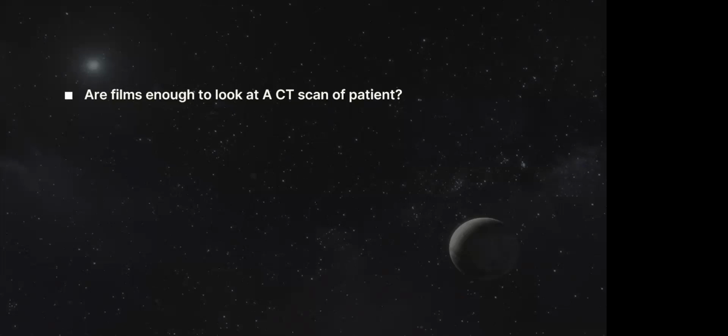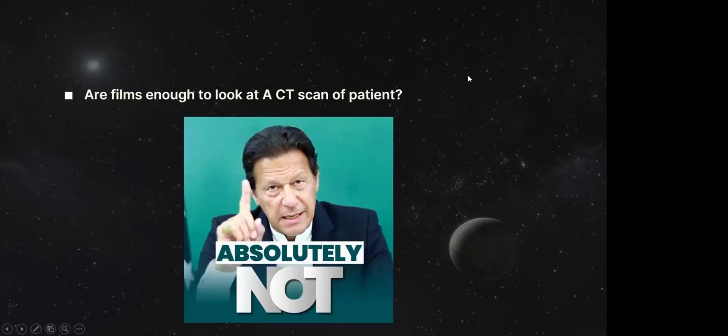So you really don't have an opinion about that. But let me tell you one thing. The answer is that you never ever completely report a CT on a film alone. You can give an opinion, but I would never give you a report or a handwritten report with my signature on any CT. Let me show you an example why it's really important not to do that.